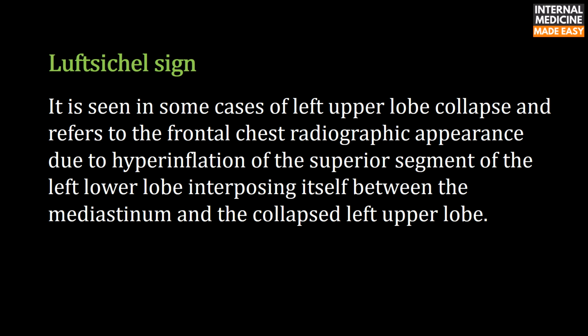Luftsichel sign is seen in some cases of left upper lobe collapse and refers to the frontal chest radiographic appearance due to hyperinflation of the superior segment of the left lower lobe, interposing itself between the mediastinum and the collapsed left upper lobe.